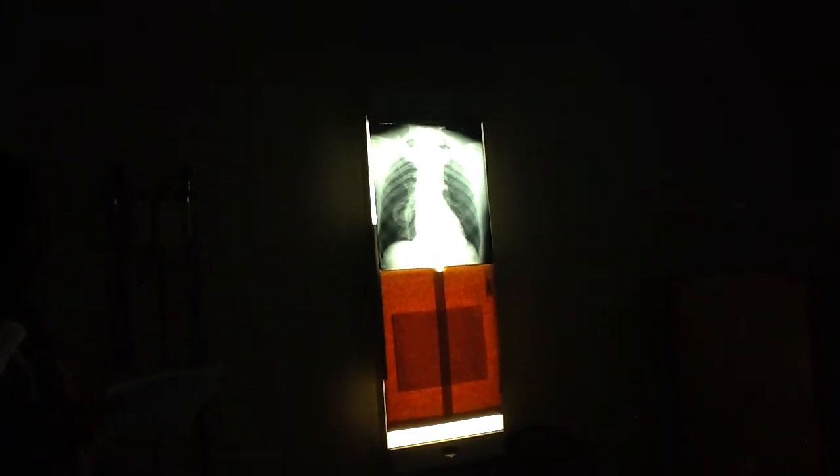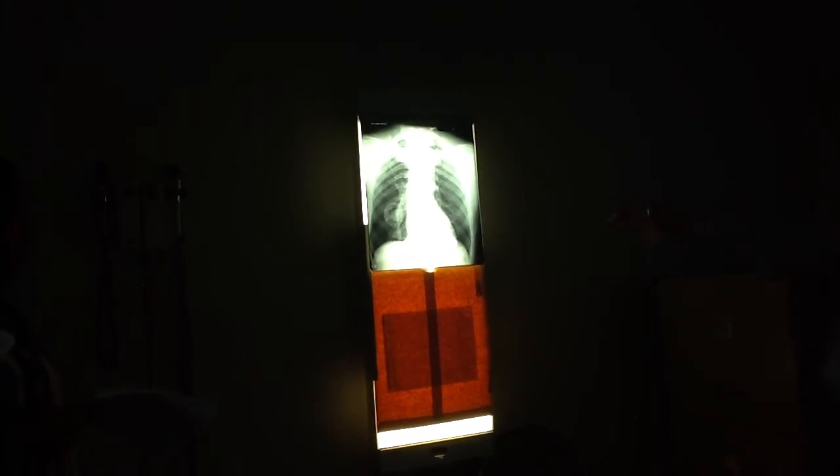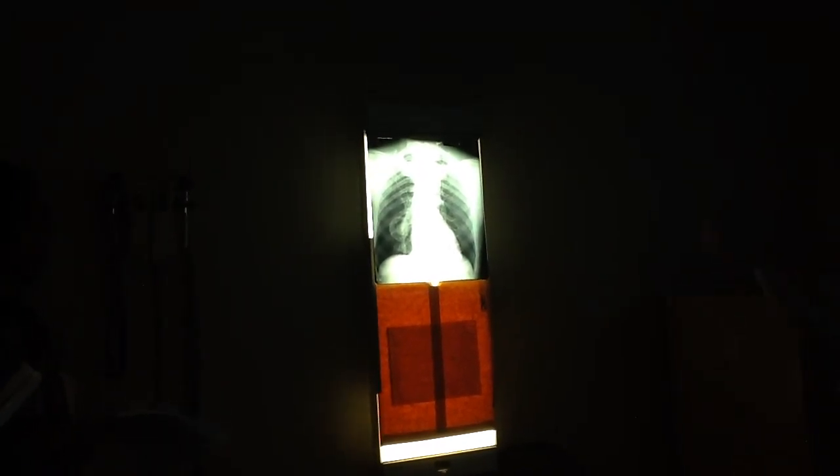How do you differentiate this from aspiration? Aspirations are typically bacterial, and they tend to have fuzzy borders. Yeah. The location is good, right? That would come up in our filter looking at location because it's medial right lung base, but the appearance is not really consistent with an aspiration pneumonia. Because remember, an aspiration pneumonia is going to be a bacterial infection, typically fuzzy walls to it. Not well defined like this.